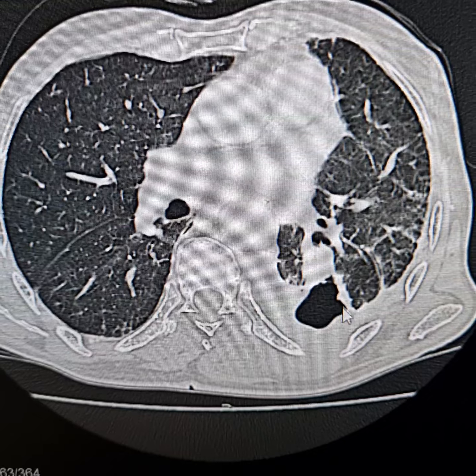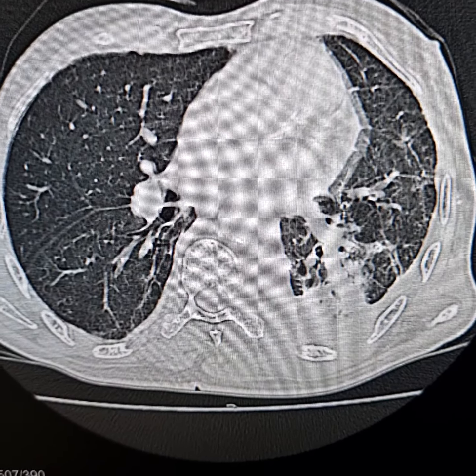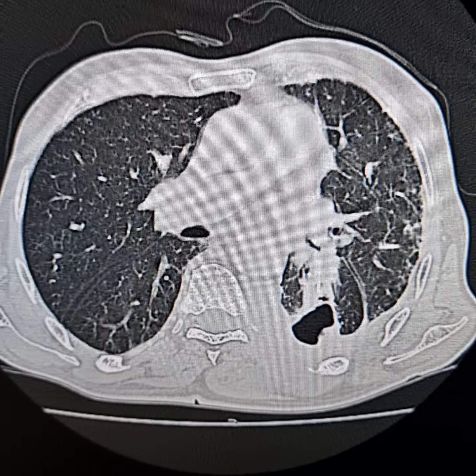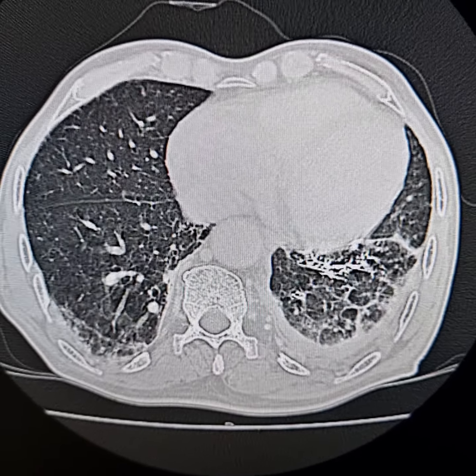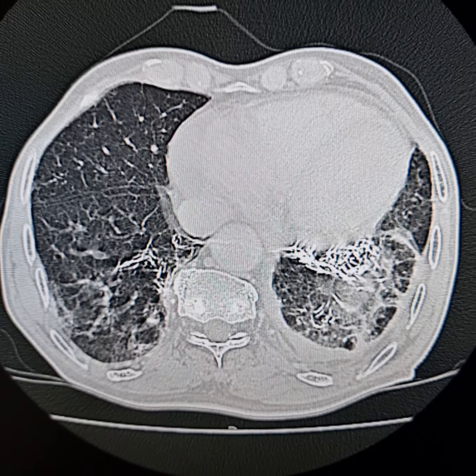Now this is a cavity here. This is the mass lesion in this region showing extrathoracic extension. I will show you the mediastinal window later on. Please observe lymphangitis carcinomatosis on the left side.